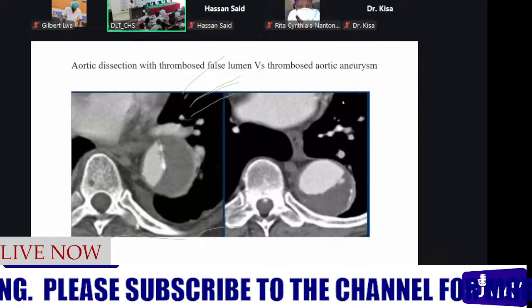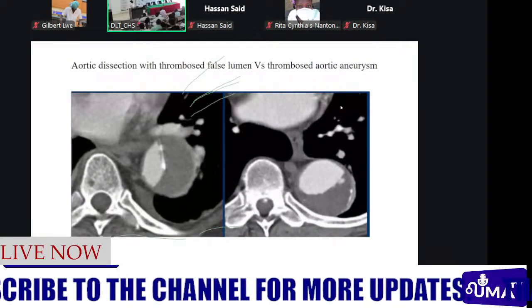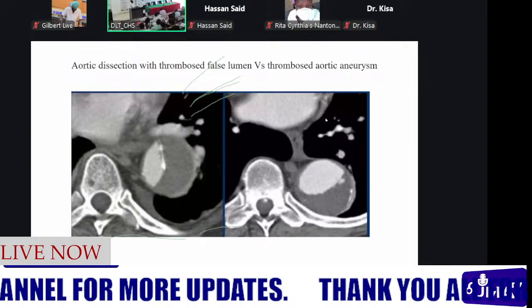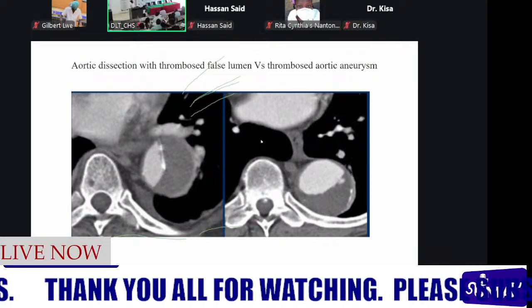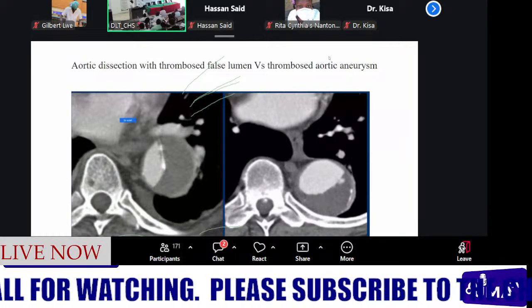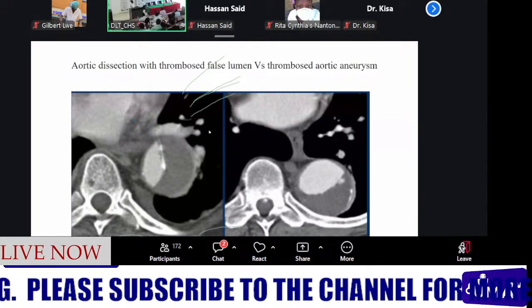Then the other thing I wanted us to take note of is how to differentiate the chronic aortic dissection, which has already thrombosed, from a thrombosed aortic aneurysm. So here we have two different images. One is aortic dissection, then the other one is a thrombosed aneurysm. And they ideally look the same, though there are nitty-gritty things that we look at to try to differentiate.